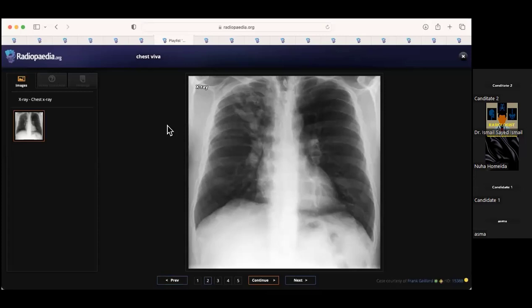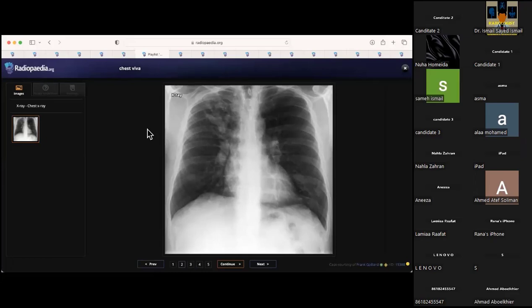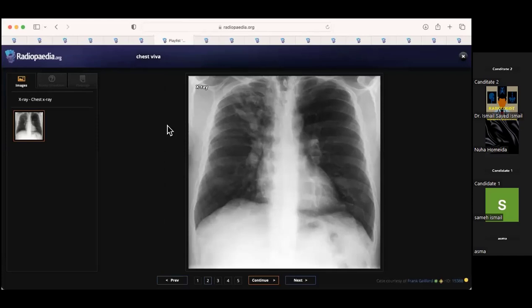I know it's associated with bronchiectasis, and I'm actively looking for any signs of bronchiectasis on this radiograph, which could be ring shadows or increased bronchovascular markings, just to show the examiner, look, I know what I'm looking for. And as you said, you'd say I'd like to revisit the history and know if the patient is a known asthmatic or has any history of cystic fibrosis, but there are no changes bilaterally, as you said. So well done.